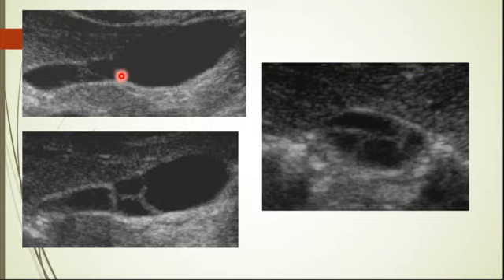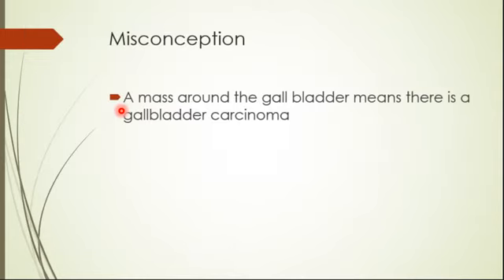Why? First of all, clinical presentation. The patient is not ill. With acalculous cholecystitis, patients must be in ICU, critically ill. There is no pain, no pericholecystic edema, no signs of cholecystitis clinically, I mean. Okay? So if you see these septations, it's just a septated gallbladder. It's nothing. Just send the patient home.